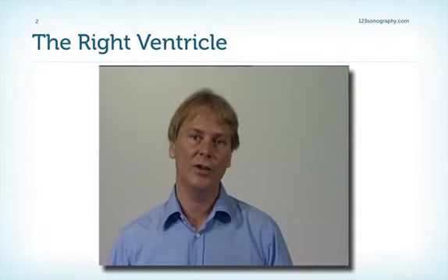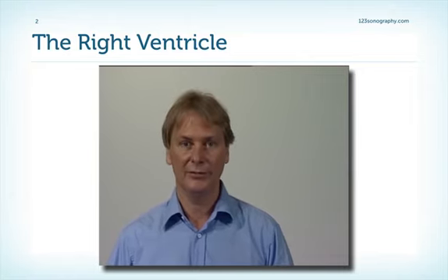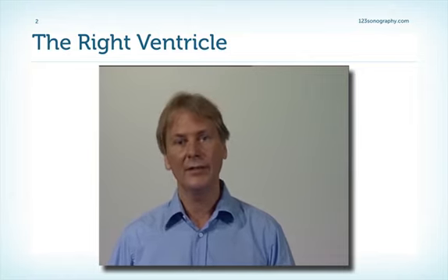Intuitively, when you learn echocardiography, you always focus on the left ventricle. However, the right ventricle is equally important, especially in clinical situations, for example, pulmonary hypertension. The right ventricle is actually more difficult to assess because it has a unique physiology and anatomy. In this presentation, I would like to show you this unique physiology and anatomy, and also show you how to quantify the size and the function of the right ventricle.